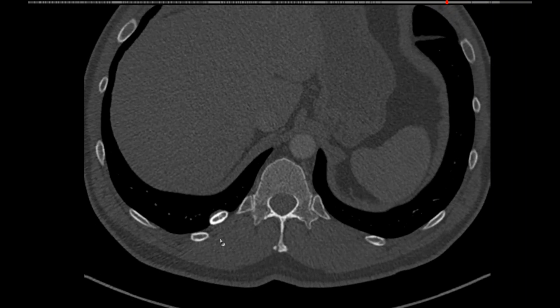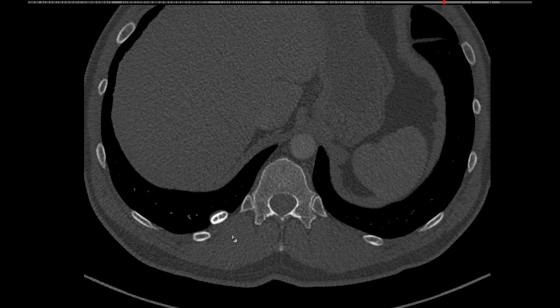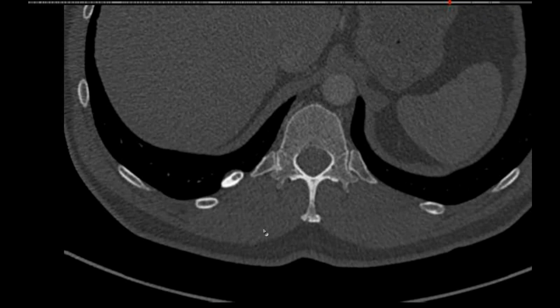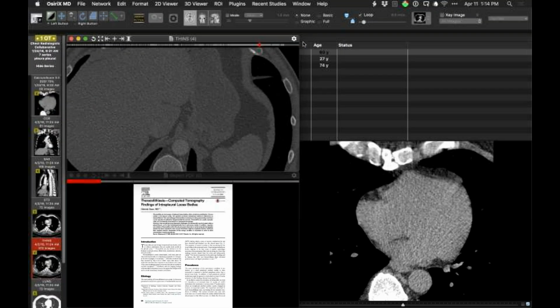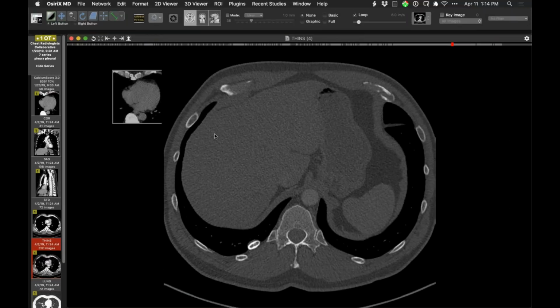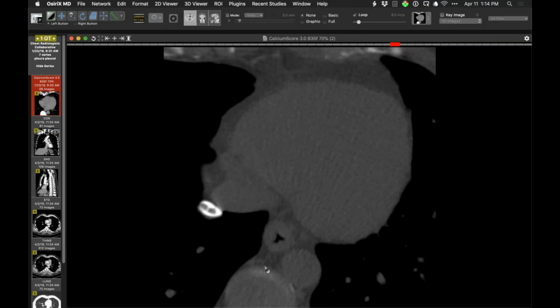It looks like marrow to me. No, can't tell. It's so interesting. It's almost like little trabeculae or something crossing that. I still can't figure out how it gets into the pleural space. I can understand the theory of this fat necrosis, it calcifies, but how in the world does it get through the parietal pleura? Yep. In a way that it's still mobile, where there's not adhesions and the pleura's up. Yep. Yeah, it's really peculiar. That's extraordinary, Howard. What a case. Yeah, look at that there.